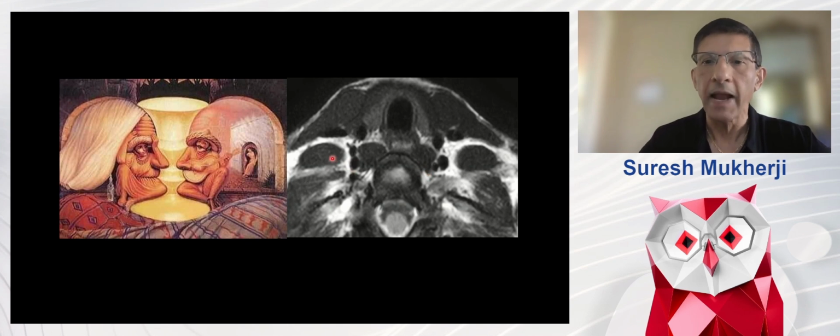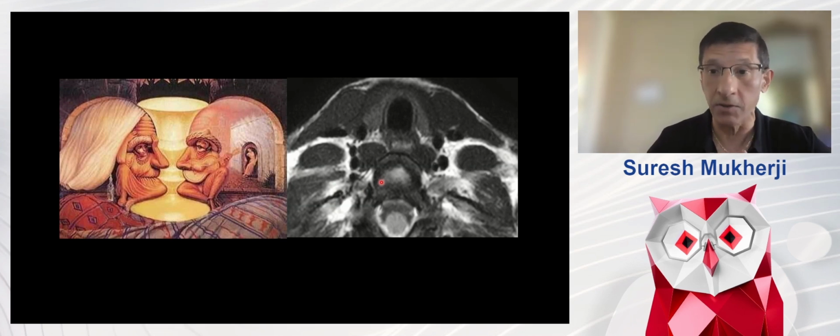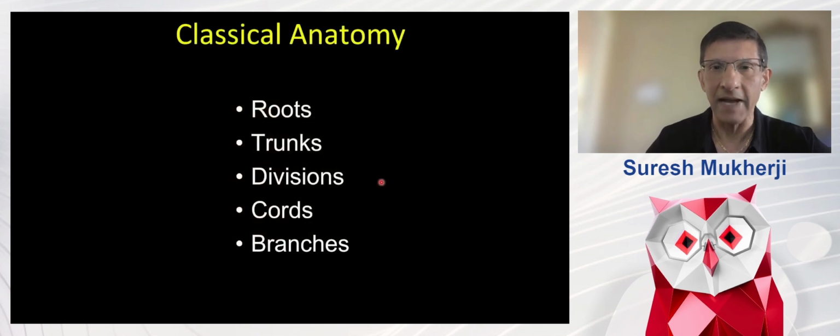And when we get done with this talk, you'll hopefully be able to see that this is the anterior scalene, this is the middle scalene, and between the anterior and middle scalene muscles is the brachial plexus. So my point is that if you've ever looked at a cervical spine MRI, a neck study, the larynx, or looked for lymph nodes, the brachial plexus has always been staring at you, like these musicians and this woman in the arch. My hope is that once you start looking, you'll always be able to identify the brachial plexus because it's been seeing you. You may not have been seeing it, but it's actually seeing you.